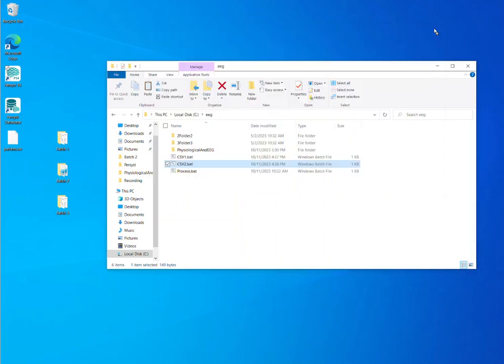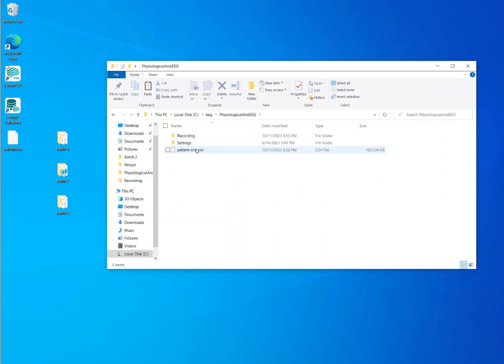You can see that one's already finished. We can take a look at that, but you can see it's 103K. It's pretty big for one column of data.